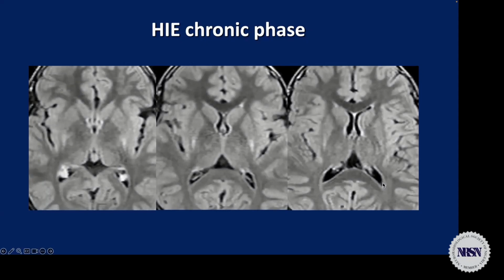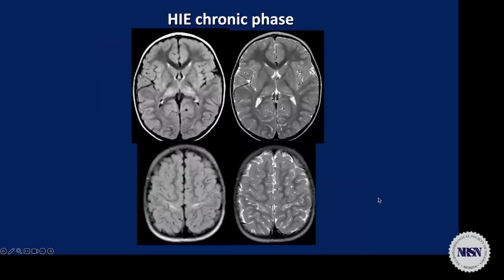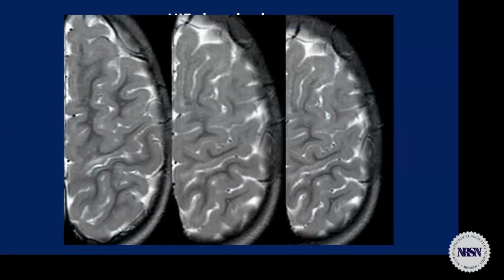And you know, there are a lot of pathologies that affect the lenticular nucleus, so this lesion can be very non-specific. But if you see together this and this, so lesions in this region here, I think it's very suggestive for end stage of HIE.